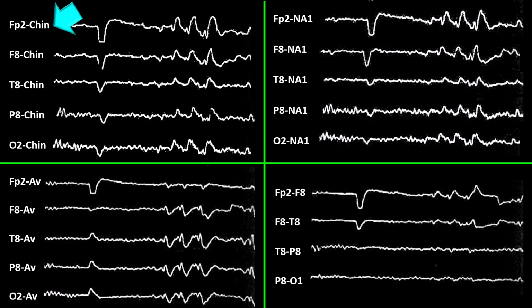Would you have described this potential as broadly distributed with frontal predominance, as suggested by the common electrode reference montage using the chin or the below the left ear reference? Would you have described this event as a posterior predominant discharge as suggested by the average montage, or as a narrowly distributed frontal potential, or miss it altogether if you just review the EEG recording in bipolar montage?